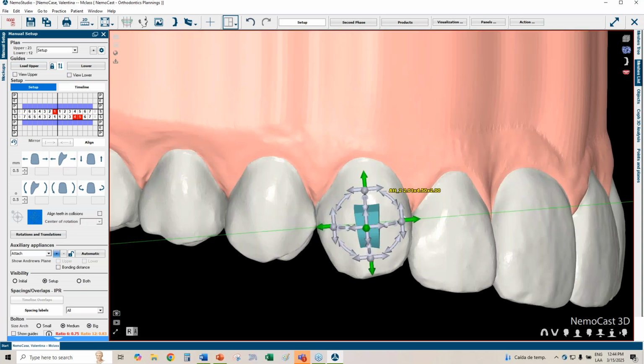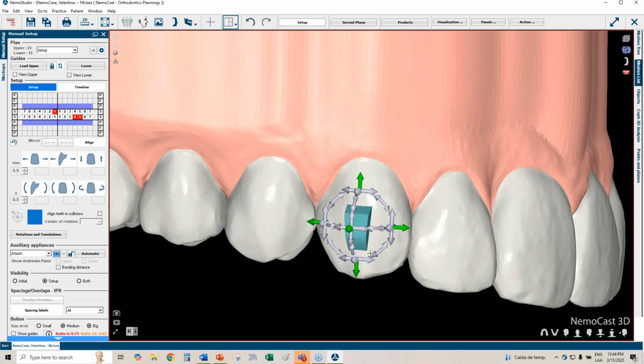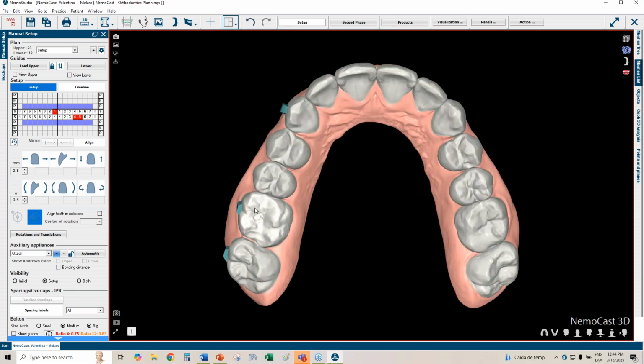It would be supported because, as we were discussing, the hardest part of the aligner is going to be the mid segment. So I already made stiff the furthest part with the attachments. I just have some retention right here in this part because we don't have that much rotation. We could leave it like that.